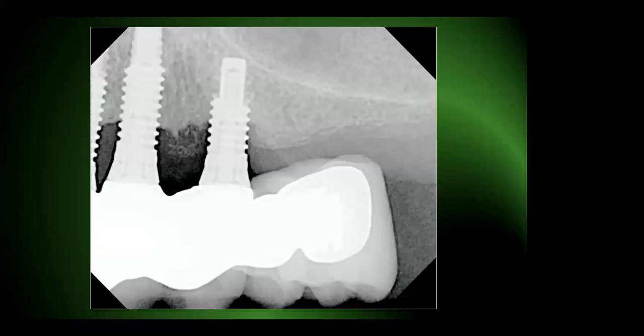So here's a case that's rather interesting, where you can see this large cantilever, and it's a rather significant cantilever. The patient is biting more in the posterior than in the anterior. So that is all shear force, and you can see all the resultant bone loss around that. But what amazes me is the cusp design. Remember last session we talked about minimal cusps, and look at how those large cusps, meaning lower plunging cusps, are hitting into that, which gives us the shear force, which results in crestal bone loss.